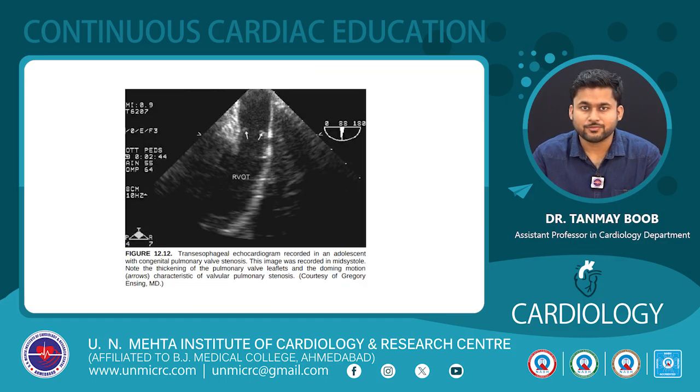This is the transesophageal view recorded in an adolescent with congenital pulmonary valve stenosis. The image was recorded in mid-systole. Note the thickening of the pulmonary valve leaflet and the doming motion, arrows, characteristic of valvular pulmonary stenosis.